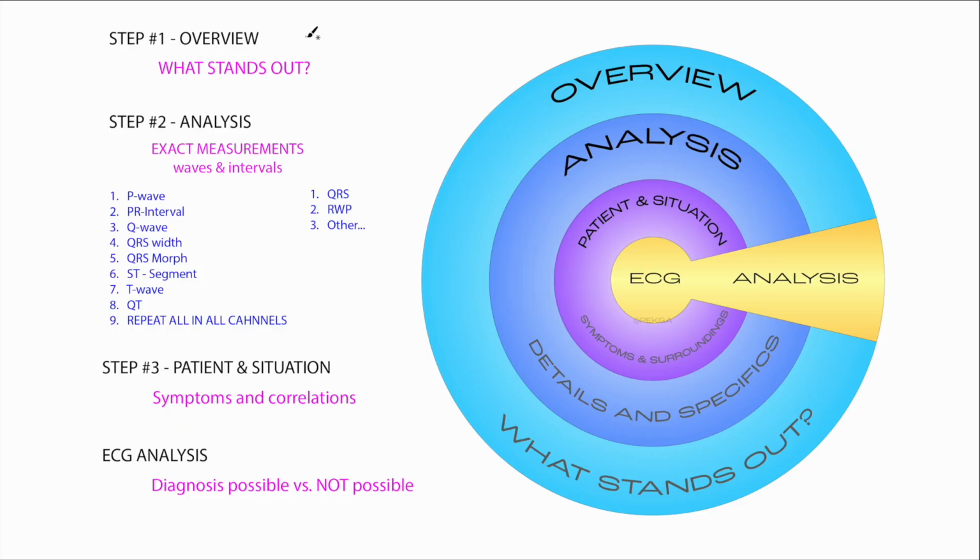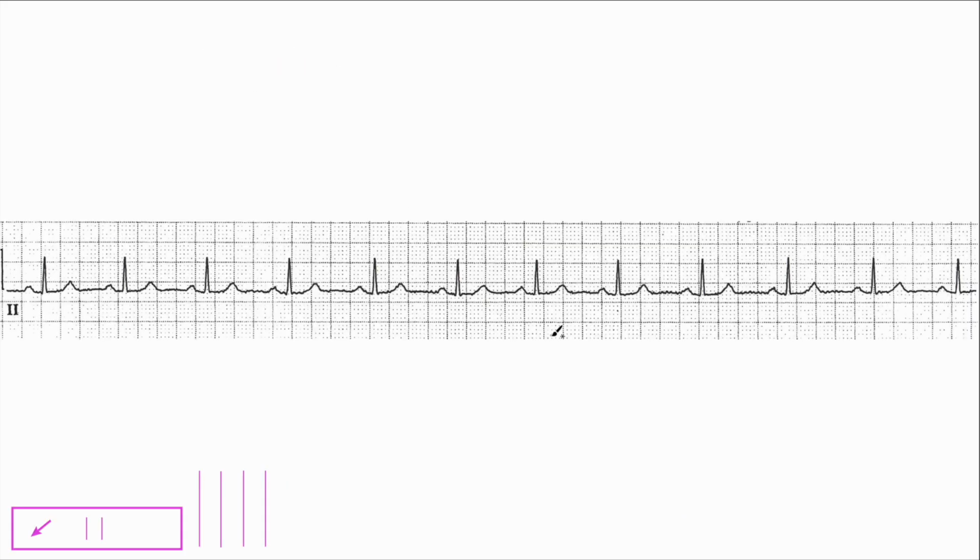First step is the overview step. So really you're just looking at what stands out to you. So you take a look at the ECG and you're like, okay, what stands out to me here?